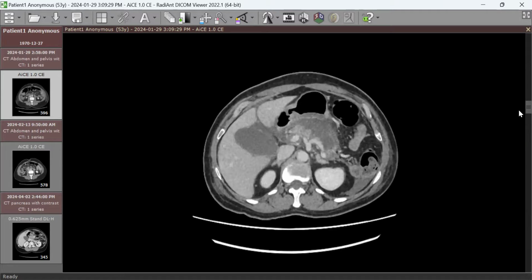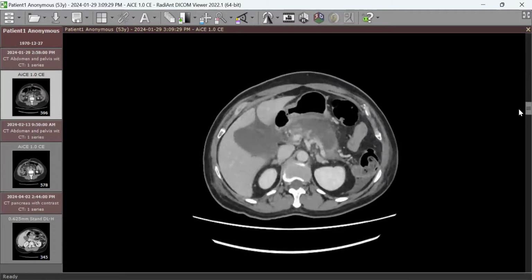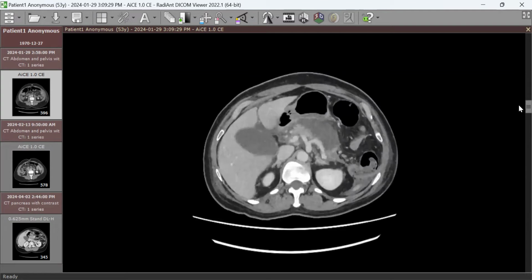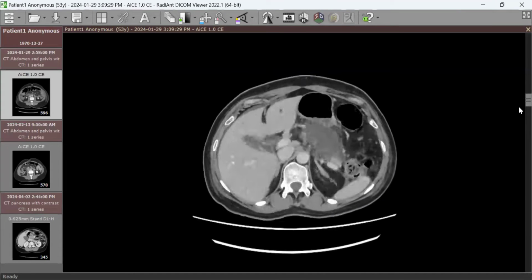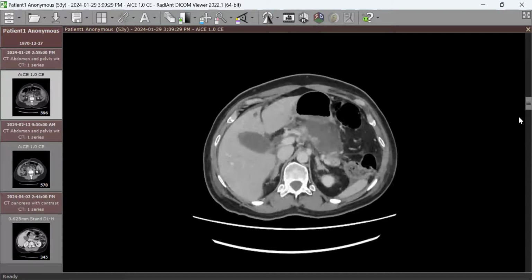The most important complication related to the pancreas is the vascular one. Exactly. Vessels, superior mesenteric artery, thrombosis. So now we can see here the splenic artery, going to the hepatic, going down to the superior mesenteric.